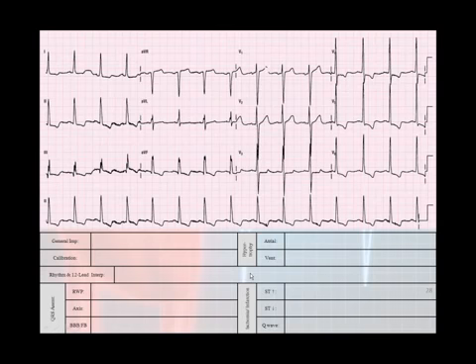When you glance at that 12 lead, you want to say, is it excessively fast, excessively slow, or any ugly morphologies? The only real ugliness you can see here is your ST segments look a little off, which doesn't actually look all that good. And you can also see here that these QRSs are actually touching. These QRSs look really tall. Does it look ugly? Not necessarily, but you do see some anomalies there. So for general impression, what you can say is tall QRSs, or you could just say looks fine, doesn't look ugly, but it does not look fast or slow.